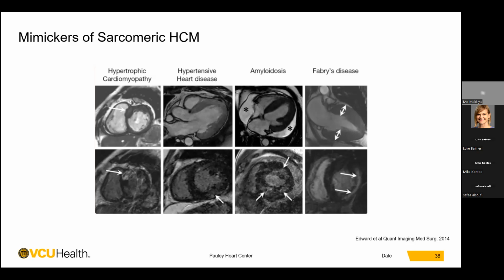Asymmetric hypertrophic cardiomyopathy imaging shows hypertrophy of the mid-septum with corresponding fibrosis mostly in the septum, or the hypertrophied area, in the first picture, which is commonly seen in hypertrophic cardiomyopathy, versus images showing more concentric hypertrophy with some patchy, non-specific, non-burdensome late gadolinium enhancement.